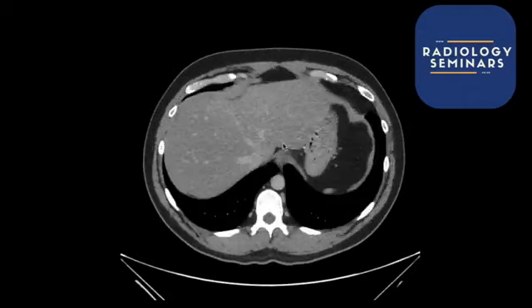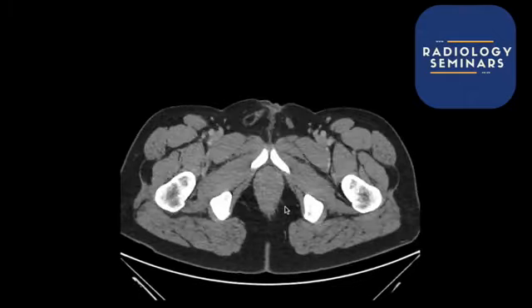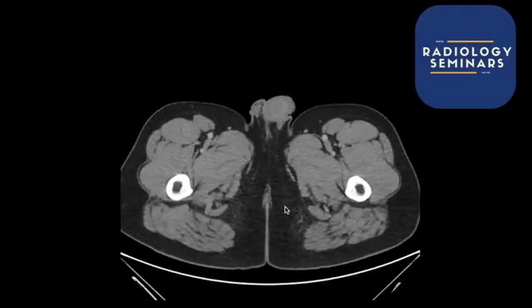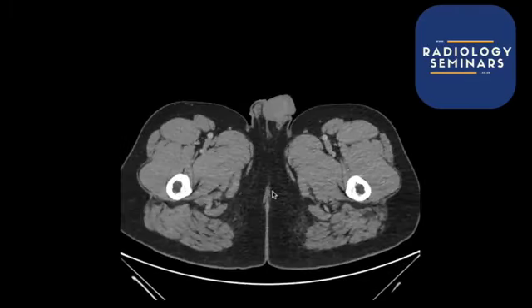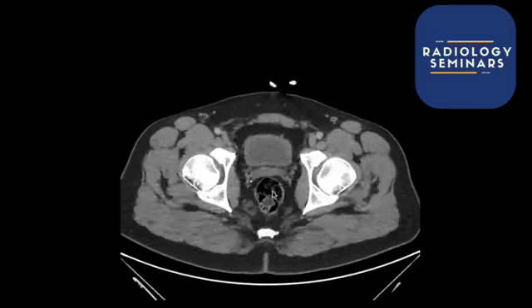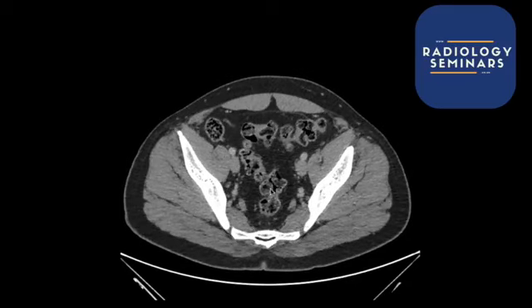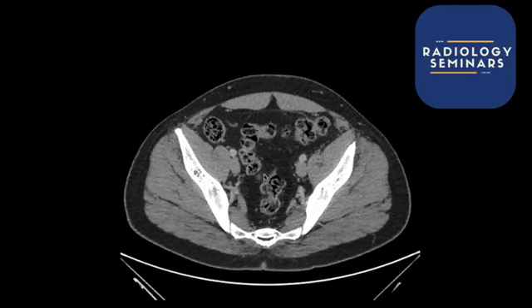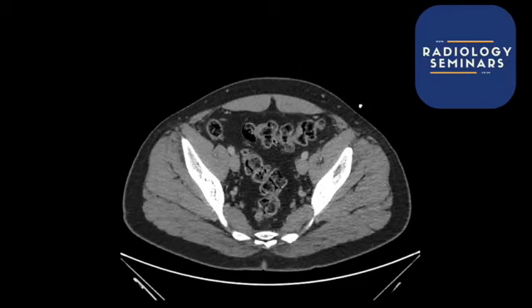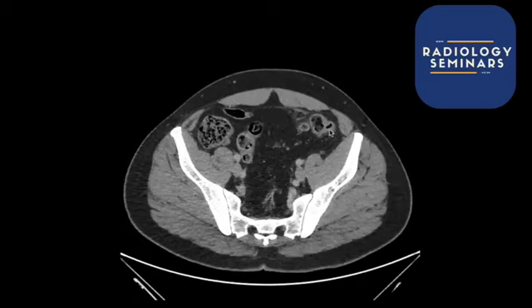Right. And then, once you've done that, I actually just generally go from the bottom, quite literally, from the bottom. You come all the way up, so you've got your rectum here, and you just want to follow around. And this can take a bit of radiological ninja skills, scrolling up and down, trying to see where it connects. And when you can't see it connecting, just scroll up and down and see, oh yeah, it does connect, all the way like that. And you want to see what the bowel is looking like.